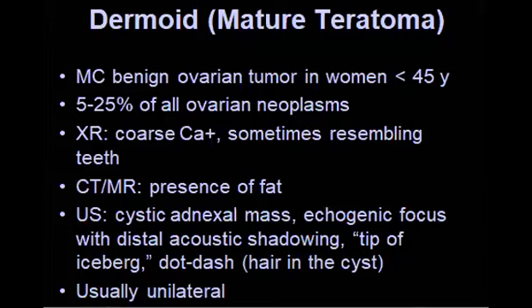X-ray pelvis, and you find on the left side something like this one. So dermoid, one of the important signs, the tooth in the pelvis, equals dermoid, so mature teratoma.